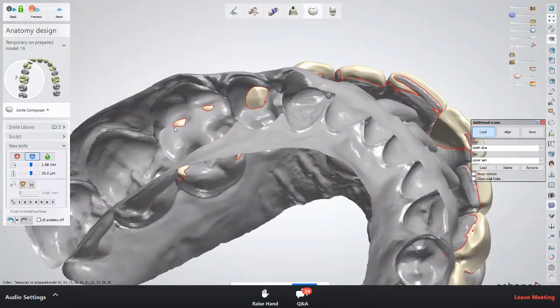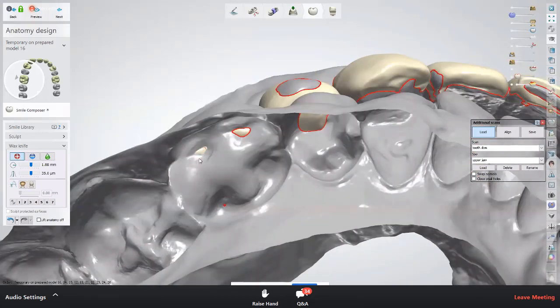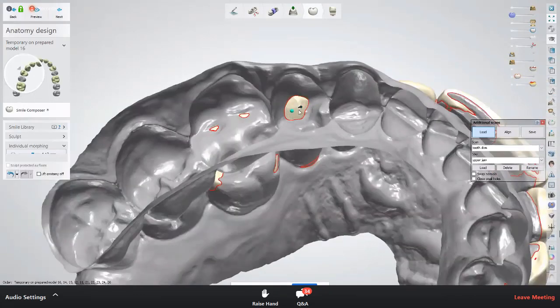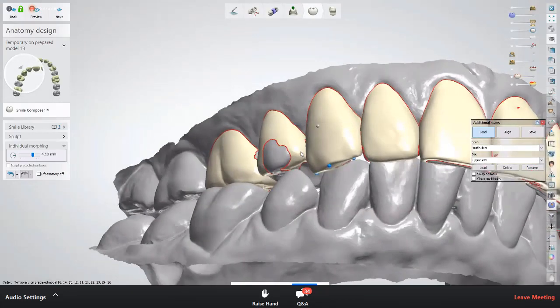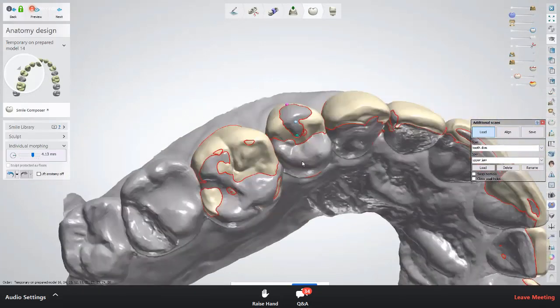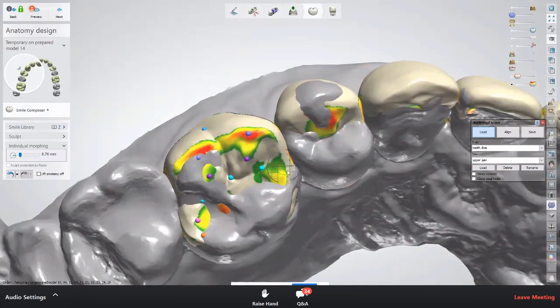And normally I try to leave as small a point as possible because the smart tools cut the full part of the tooth, and then you really don't know where it's going to cut, and you also don't know the distance you're going to get all over. Because when I'm choosing to put this small contact point, if I take my measurements, then you can see that I have green and yellow everywhere except close to my contact point.